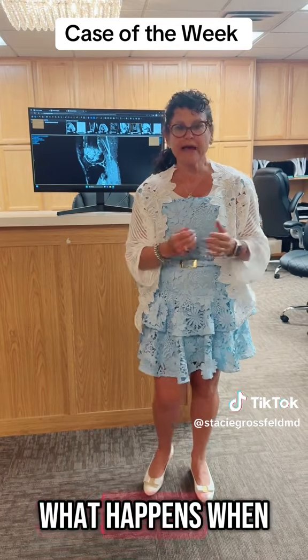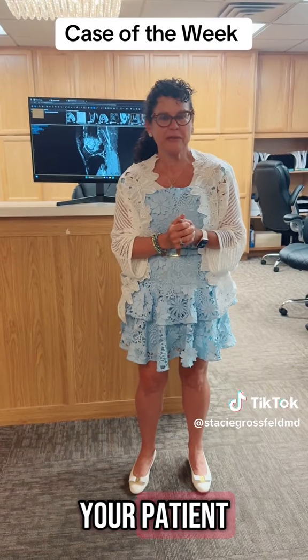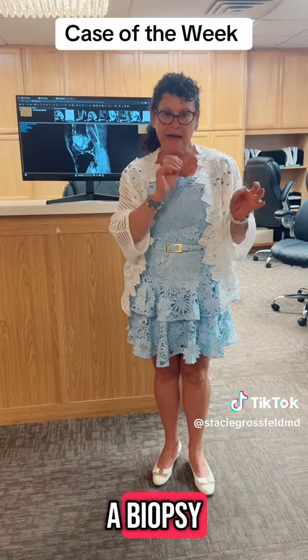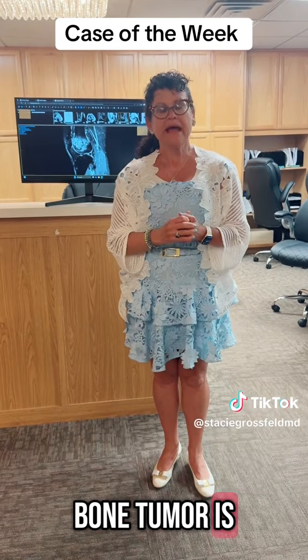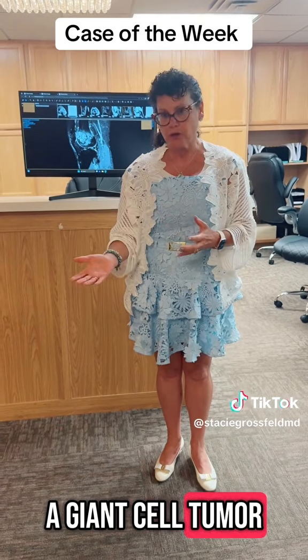So what happens when this MRI scan comes across you in your office when you're seeing your patient? The first thing you're going to want to do is refer this patient to an orthopedic oncologist. They will need a biopsy to confirm what the soft tissue diagnosis is or what the bone tumor is, and then treatment. I believe this is probably a giant cell tumor.